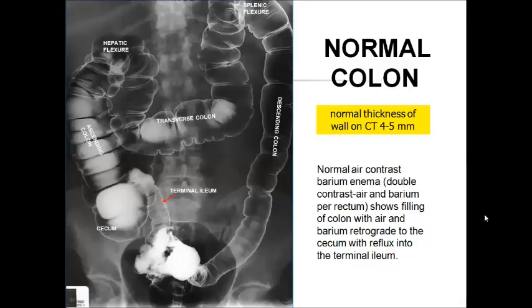Colon pathology. Here is a picture showing us colon after barium enema, then after evacuation of barium with feces, and inflation of air after this. The rest of barium and presence of air in the colon forms a picture of so-called double contrast study for rectum and colon.